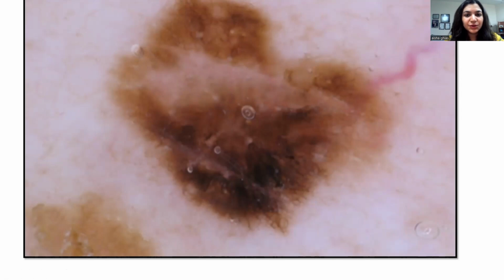So if you see many patterns, then what? Then the color is disregarded. You just see their arrangements. Now see the arrangements of the structures.